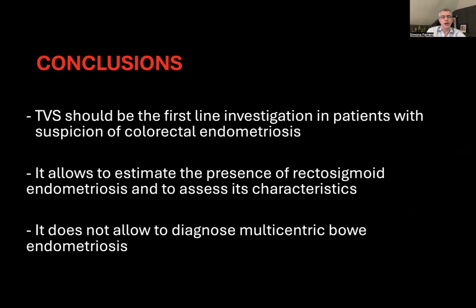In conclusion, transvaginal ultrasonography must be the first-line investigation in patients with suspicion of colorectal endometriosis. It allows us to estimate the presence of colorectal endometriosis, but also to assess the characteristics of the nodule. However, it does not allow us to diagnose a lesion located above the sigmoid, and therefore it does not allow us to establish the presence of multicentric disease.